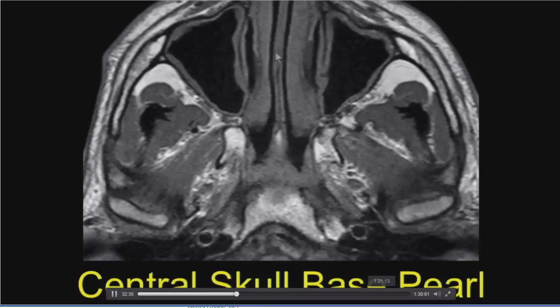So here's a pre-contrast T1. I look at the nose and it's dark, so I know it's pre-contrast. Just as we mentioned, here's that condylar head. If I find the medial part, go a centimeter medial and a centimeter forward, then I see V3 right there coming down under ovale. And I think about central skull base pathology on pre-contrast T1, because where there's bright fat and where there is replacement of that bright fat is very important for a lot of these pathologies.